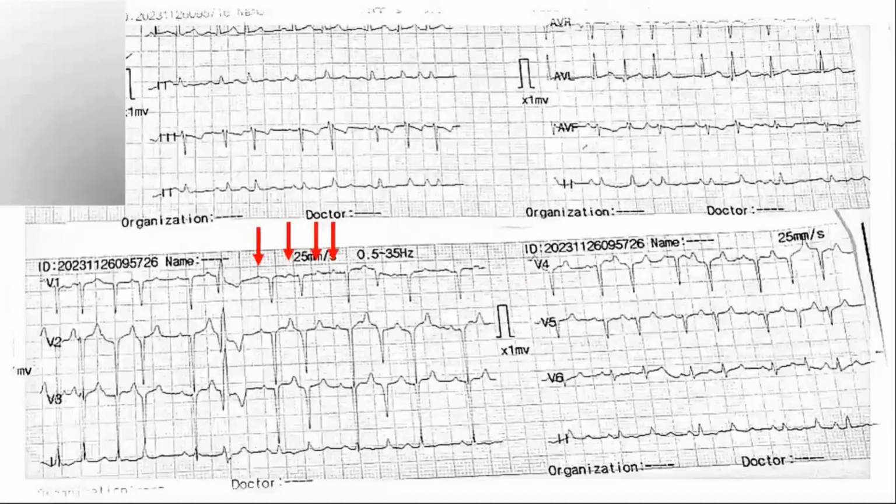So this was an atrial tachycardia. I think that's pretty clear. You can see huge discrete P waves. Look at these intervals. It's very obvious, there's no need to measure that, but still I have highlighted it for you. So this is a long, this is a short.